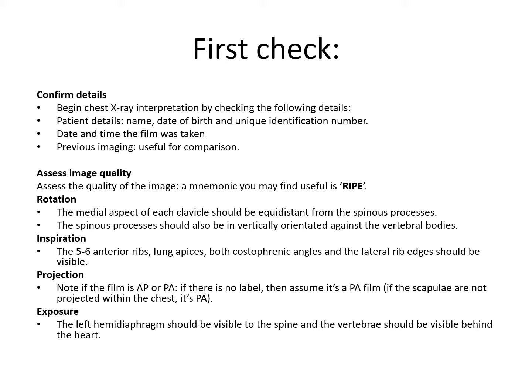Chest x-rays are normally reported. You can find the doctor's report next to the x-ray itself. And you can do different things like change the brightness and exposure, look at different x-rays, look at two x-rays side by side, and bring up all the other previous images they've had.